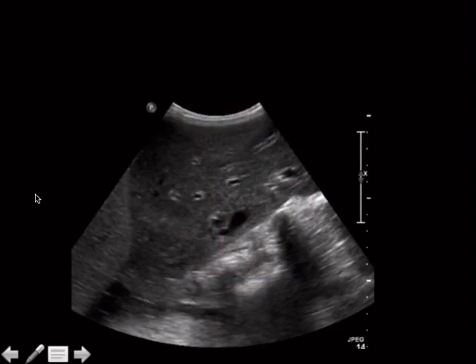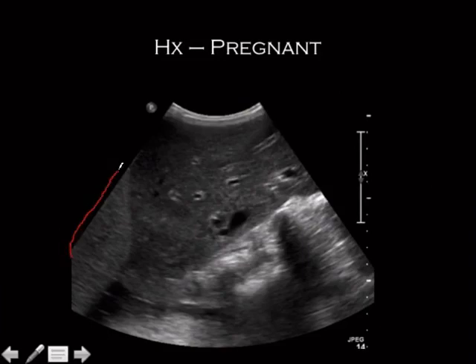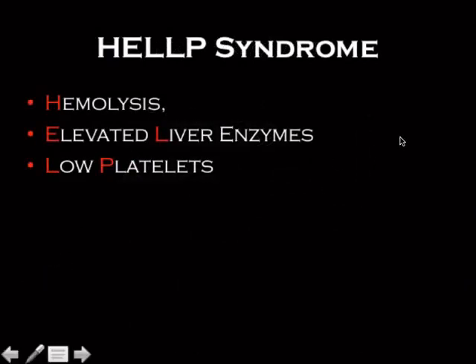All right, well, what about this one? Ooh, pregnant. What's this? That's not supposed to be there. Remember this? This is like third-year med school stuff.